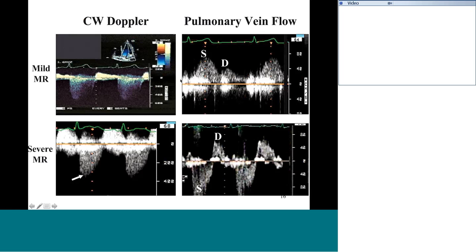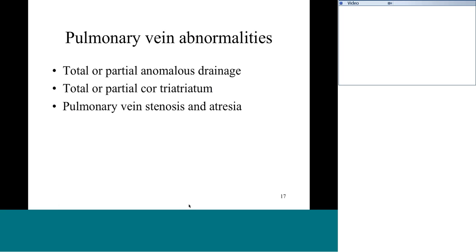And whenever there is a mitral regurgitation, the more and more severe the mitral regurgitation, the systolic wave will have a reversal. So this is the importance of understanding the pulmonary venous Doppler patterns. The normal Doppler pattern will have a systolic wave more than the diastolic wave, and the atrial reversals will become more prominent in diastolic dysfunction.